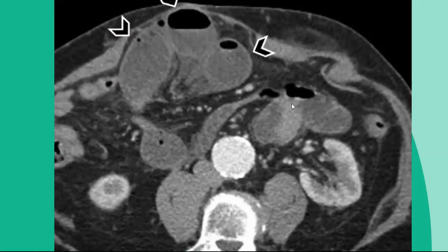This is the balloons on a string appearance of small bowel obstruction. This leads to increased intraluminal pressure and obstruction, causing venous obstruction with resulting bowel wall thickening and edema.